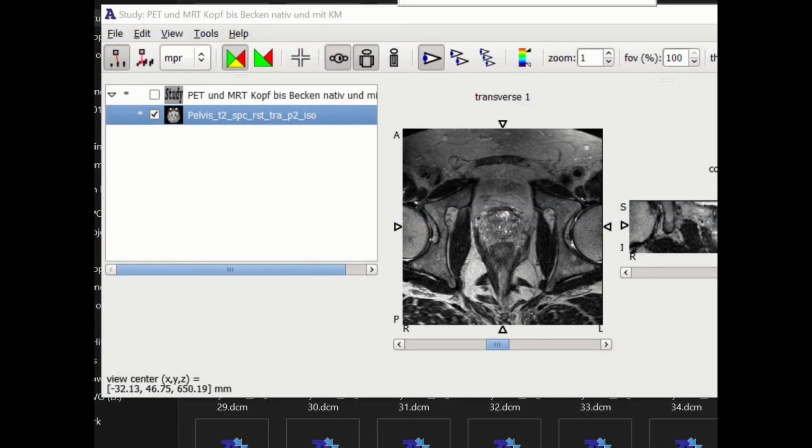We are now going to look at the results of the segmentations that we just performed with our network. These are prostate images, as we already said. First of all, we need to clarify that after performing the segmentations with the network, there's some post-processing that one needs to do.